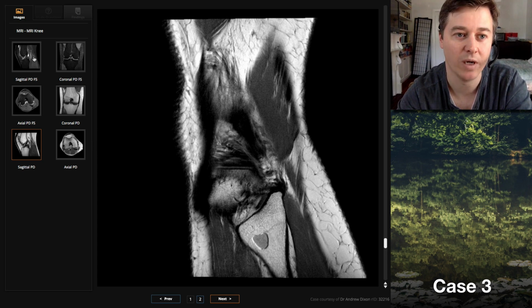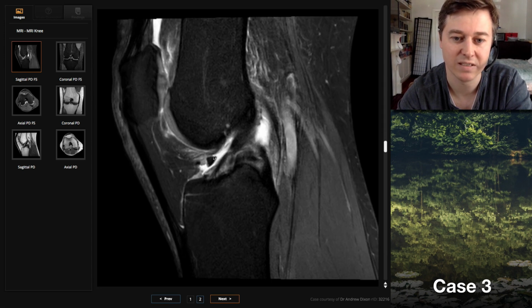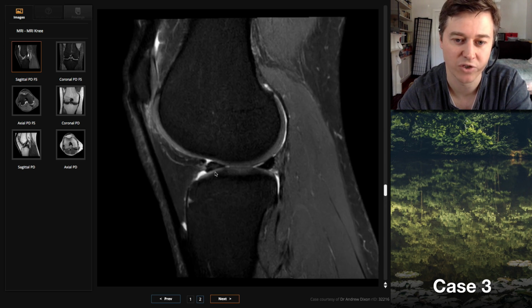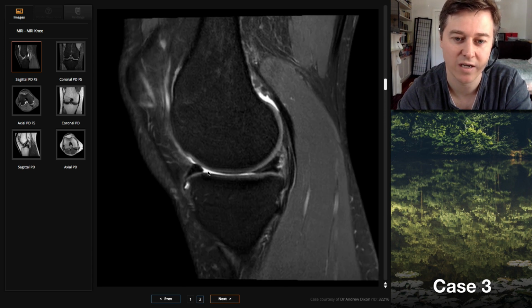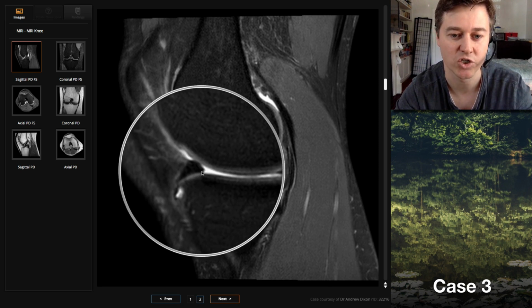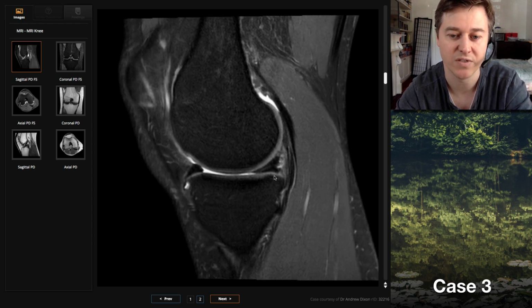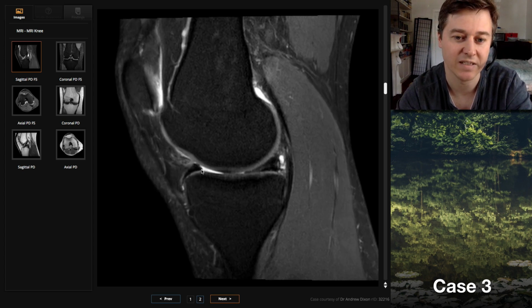It's actually quite a difficult one because I think a lot of people, when they spot this fragment of meniscus here, because it's closer to the lateral meniscus, they kind of assume that it's come from the lateral meniscus. But it's really important to always, as you did, assess the volume of the menisci and go, oh, hang on, this anterior horn of the medial meniscus is much smaller than it should be, and it's truncated. The inner free edge is lost. It should usually be a bit smaller than the posterior horn, the anterior horn, but in this case, it's way, way smaller. So as soon as you see that, you need to explain it either through a previous partial meniscectomy or a displaced meniscal fragment.